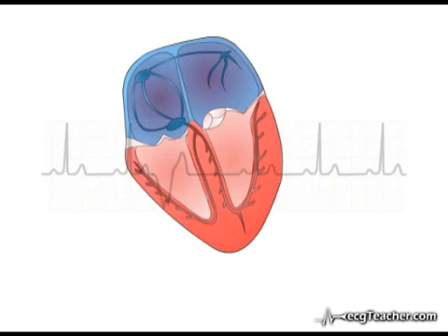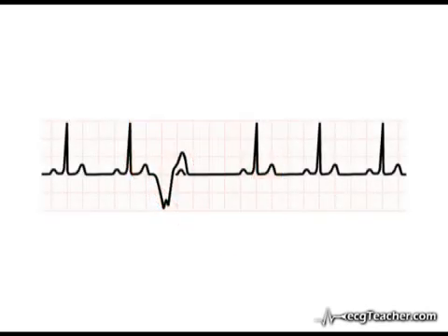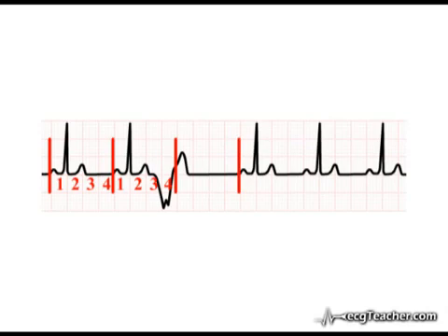Also, in this particular example, as the sinus discharge occurred during ventricular repolarization, it is buried within the T wave associated with the ectopic and is not visible on the ECG readout. We would still predict that the next sinus discharge would occur at this point, a further 4 squares on. This is indeed the case.